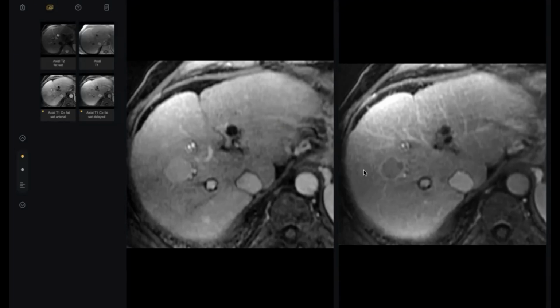No. This lesion, by the way, has typical criteria. It is HCC. Why is it typical HCC? It has the three typical major criteria. One of them is arterial enhancement and washout. One second. Which type of enhancement? Not all enhancement is typical for HCC. Only one type, I mentioned before. Homogeneous arterial? No. Hyperenhancement.